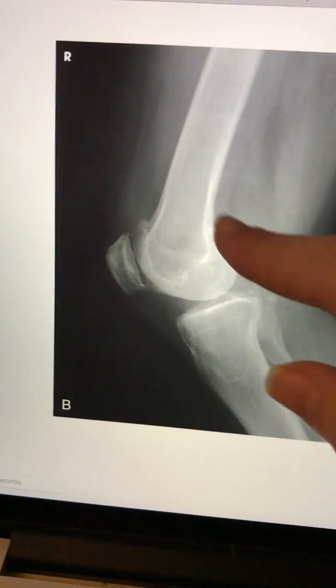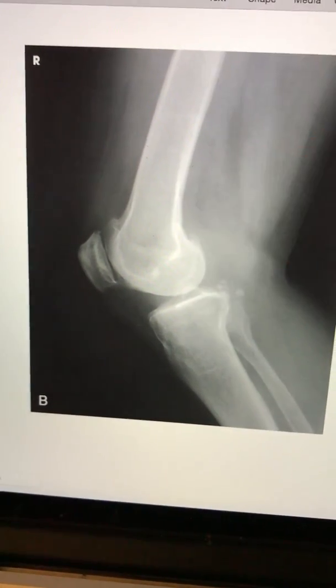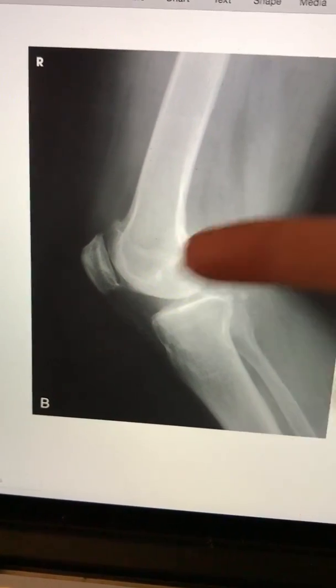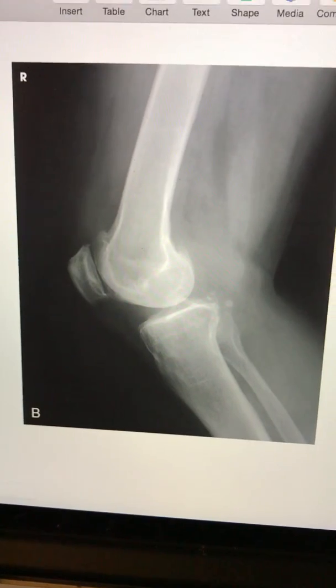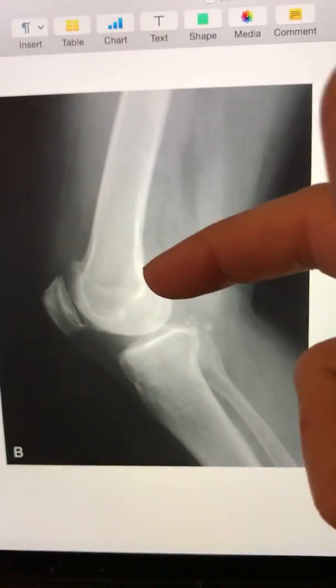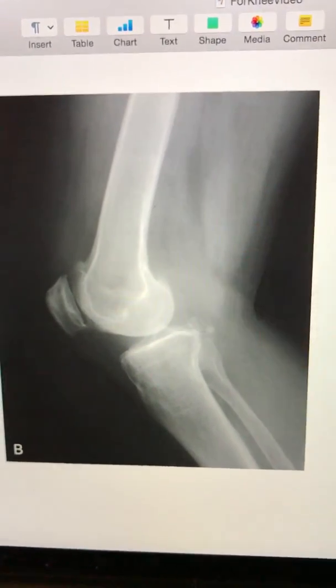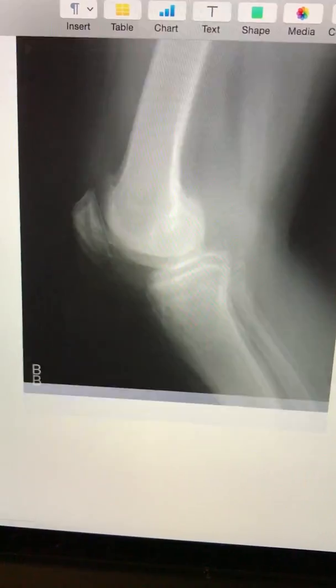So here it's a good angle because it's very well superimposed. If it wasn't properly angled or properly positioned, you would notice the rotation right in this general area. So this looks good.